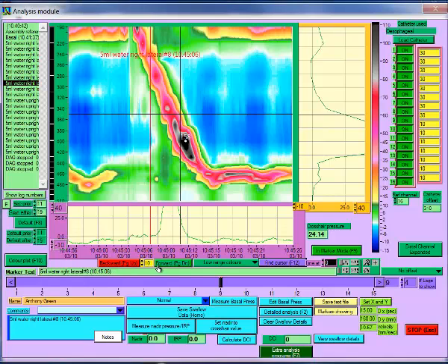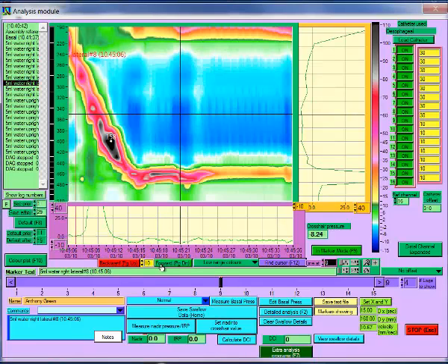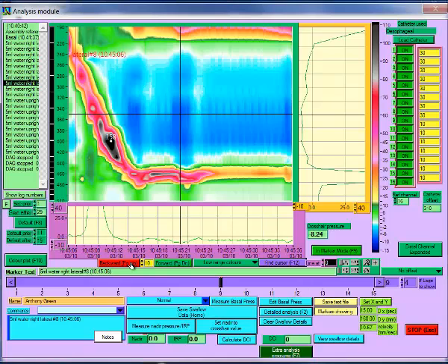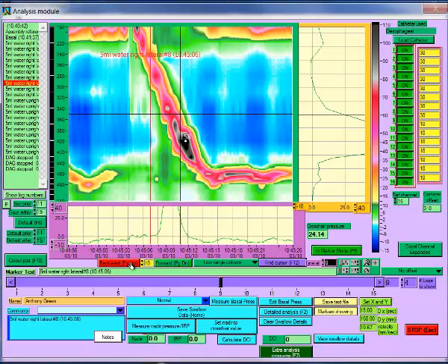You can move forward and backward to a limited extent using the buttons located above the marker text box. The data will move by the number of seconds indicated in the yellow control. You can use the expansion tools to examine the data in more detail.